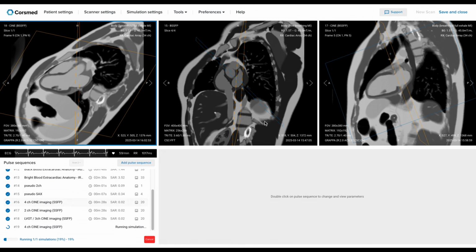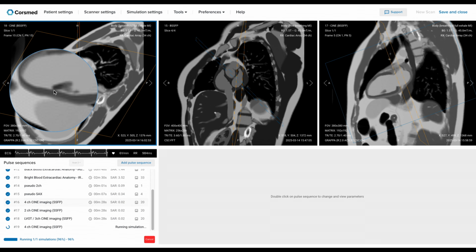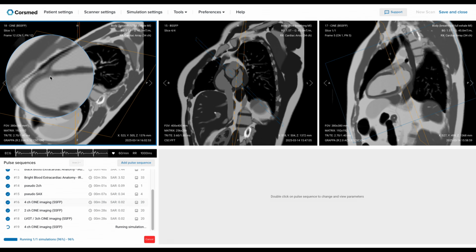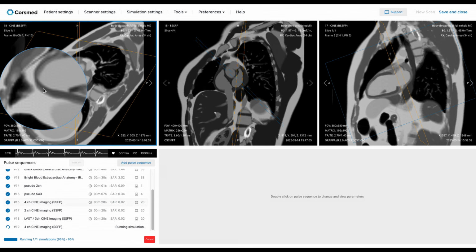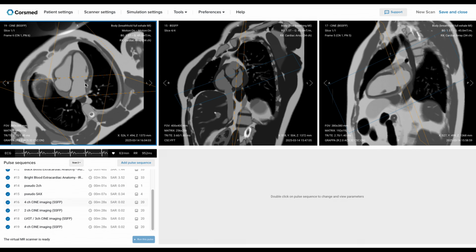One of the main things we should keep in mind while scanning is the risk that the patient might move or breathe differently. This can affect how clearly we see the endocardial borders. Later, we'll talk more about why that matters for post-processing. But for now, just remember that we need to see the inner edge, called the endocardium, and the outer edge, called the epicardium, clearly in the left ventricle.